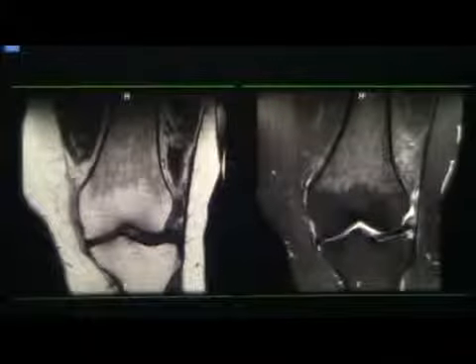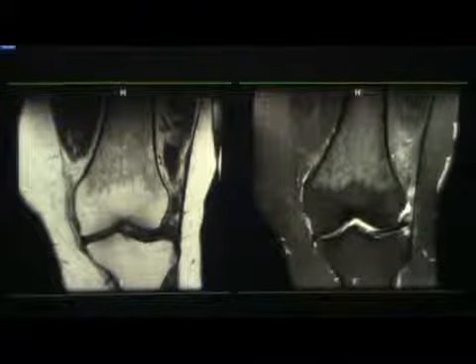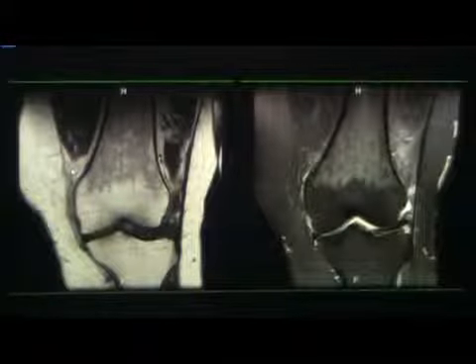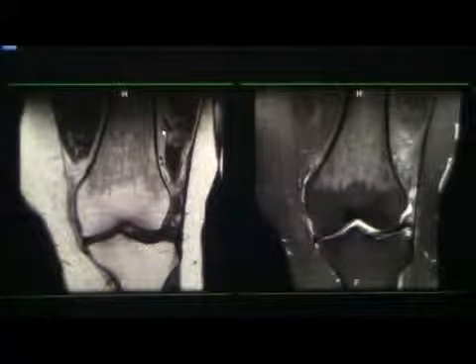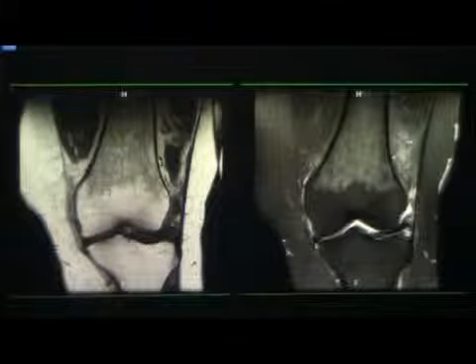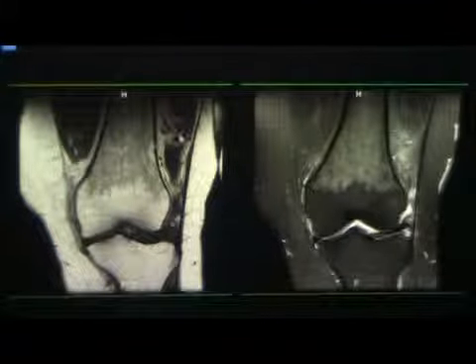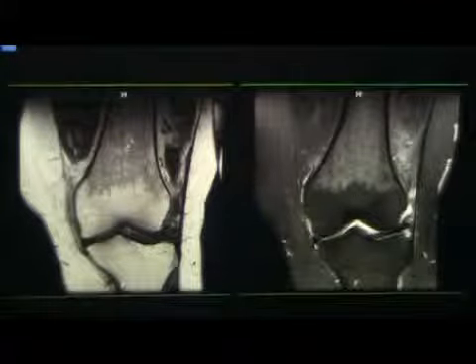Or sometimes you get something like this. It looks ugly, right? There's a lot of marrow signal change here, which is bright on T2 weighted images or fat saturated images, so you start thinking bad. But your clue is, you compare this to the muscles. If it's brighter than the muscle on a T1 weighted image, you're fine. That means it has fat within it, it's a benign red marrow. If it's darker than the muscle or iso to muscle, you start worrying. Then you look at other stuff.